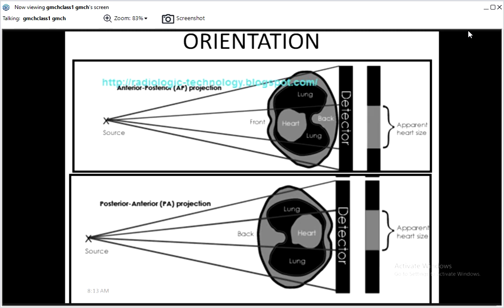That is the reason why, when we are commenting on cardiomegaly in a child, that is, an increase in heart size in a child, you have to do a PA view. You cannot rely on an AP view because in an AP view the heart is supposed to look large. You cannot say whether this is due to the disease process or due to technical reasons, because the radiations are coming from the front and the heart was nearer to the source of light during the radiation exposure.